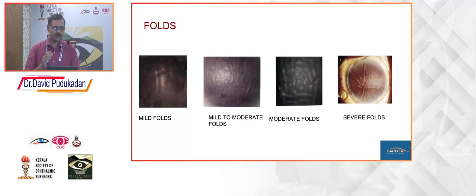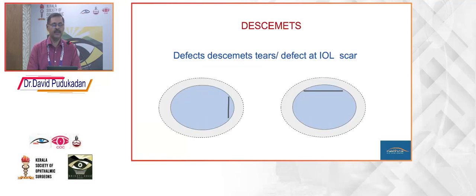And in mild to moderate folds, they would be even deeper and wider. The extent will be much more in case of severe folds. Any defects in the Descemet's membrane as a result of surgery or which have occurred during harvesting of the tissue also should be documented.